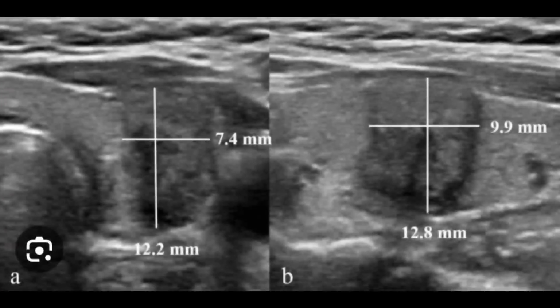Pay attention to its calcification, and the presence and size of calcification, because it gives you a particular type of carcinomatous appearance. Nodularity and its vascularity are also important. So this was one of the important features which I have explained: the AP diameter would be greater than the mediolateral length.